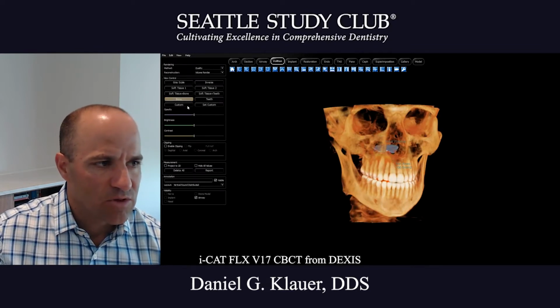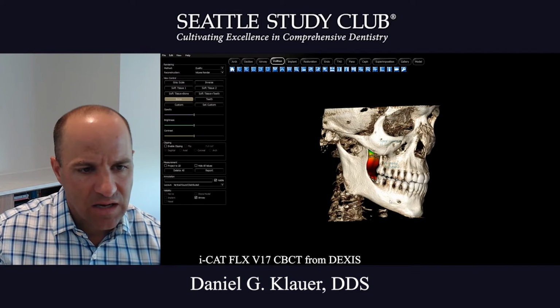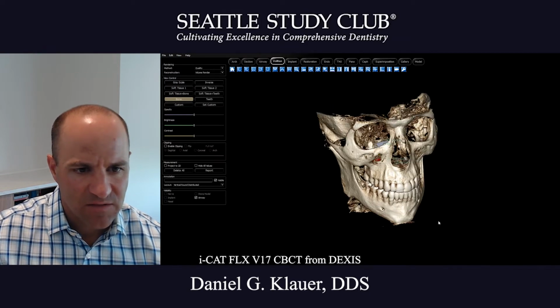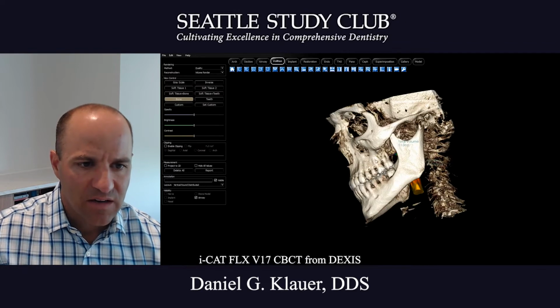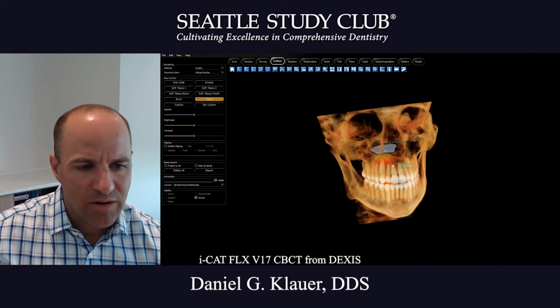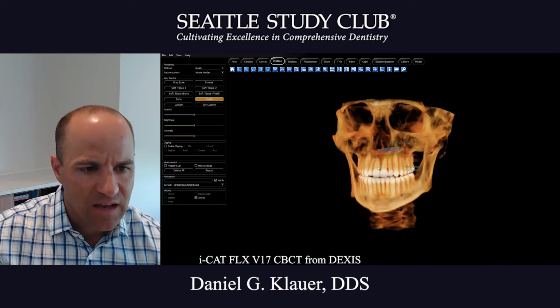And the volume render is great for looking at a macro view of what's going on and what the symmetry of the bone looks like. And mandibular plane angle, we see some pronounced gonial angles there. We'll see some calcifications in the styloid process area. And it's good to look at this view if you're doing an ortho case, to look at crowding or root angulation and stuff like that.